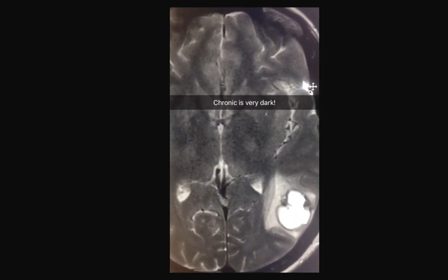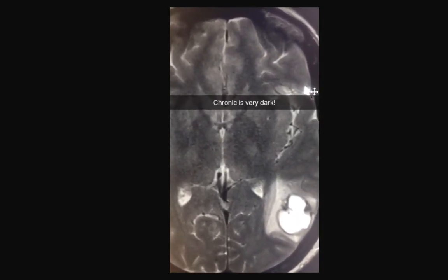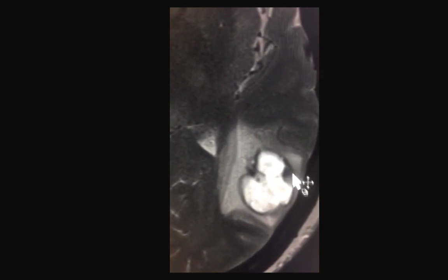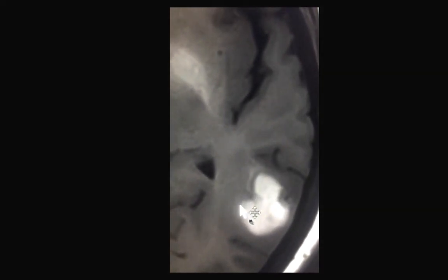Another important piece of information is that chronic bleeding, hemosiderin, is extremely dark on both T1 and T2 weighted images. And as you see here on the T2 image, the rim is extremely dark, consistent with the formation of hemosiderin at the edge. To confirm, the rim is relatively dark on the T1 weighted image as well.